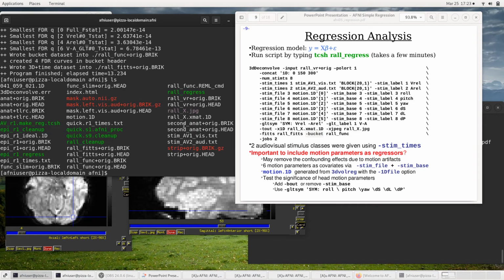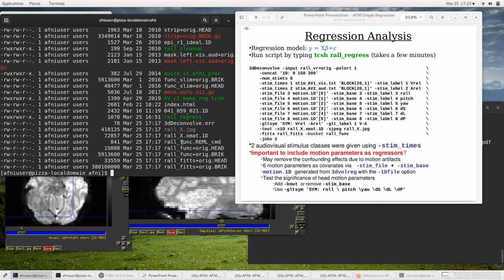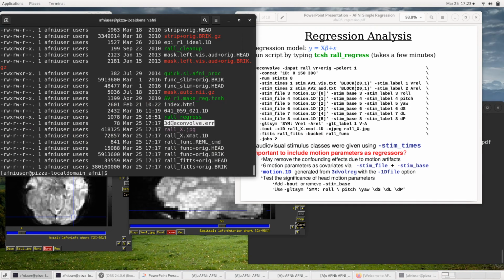And now when I type ls, I see some of this stuff output. I'll type ls -ltr just to sort by time with new stuff at the bottom so we can see what it produced. So here's the script we ran. It dumped any warning messages that were also on the screen, but it saved them in a text file. Here's our JPEG. You can view it however you want to. I'll use an AFNI image viewer just for kicks.